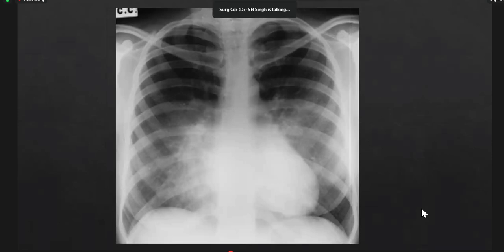So that is how you work on a chest X-ray. If you say a unilateral breast, sir, there is a mass lesion in one of the ribs, or a vertebral compression fracture, most likely it's a CA breast with METs. The examiner is just going to clear you there and then. He will not even go to the CT scan. So that is how your mind should start working.